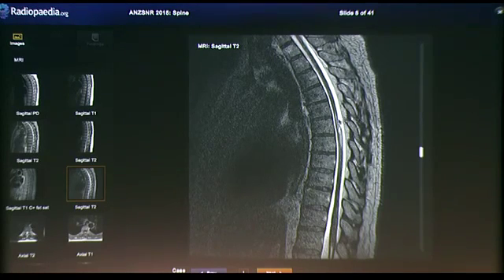If there'd been surgery in that region, you should be able to see the laminectomy defect and the abnormality in the overlying subcutaneous tissues. If there's radiotherapy, often you get a good clue to that by seeing fatty replacement in the adjacent vertebral bodies.